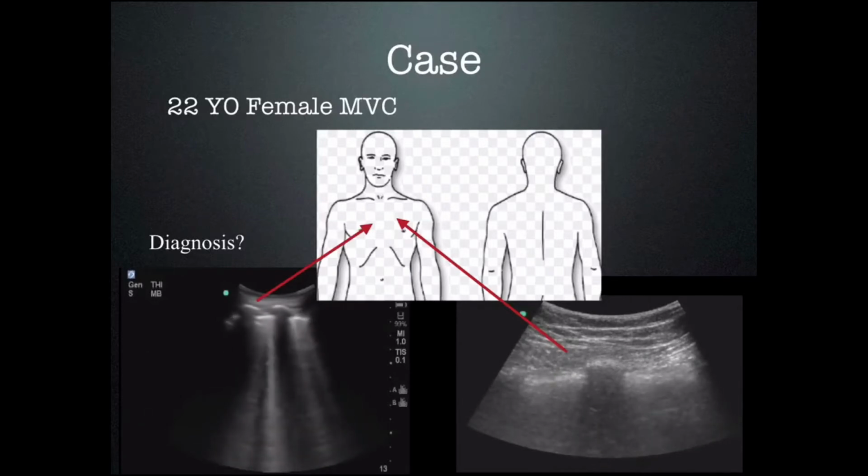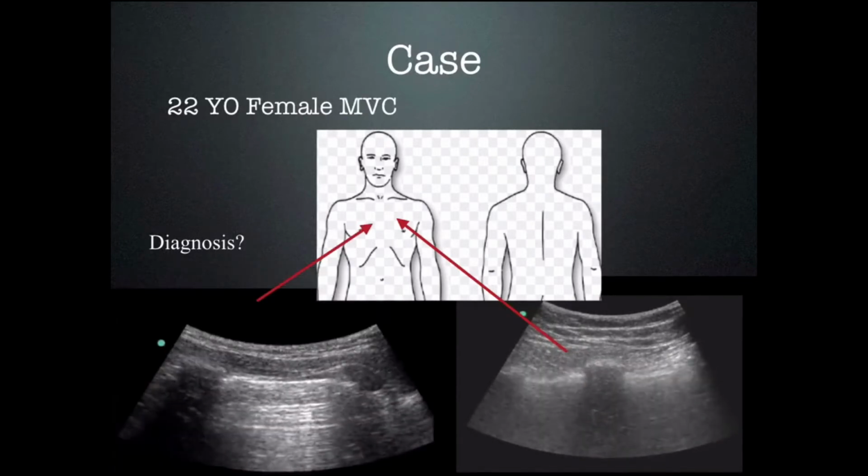You're correct. This is a pulmonary contusion. It is causing edema or blood to form in the alveoli where the steering wheel hit their chest on the right side. The left side is normal. This is isolated pulmonary edema or isolated lung rockets, and in this case, that's a pulmonary contusion.